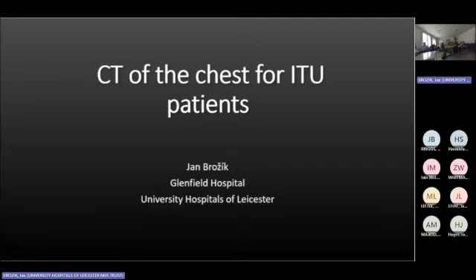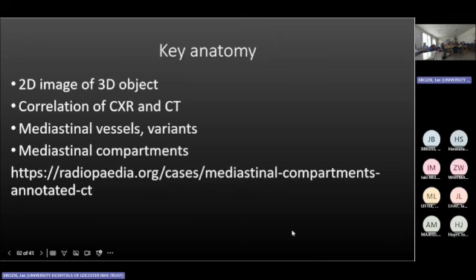Okay, so last time we spoke about chest X-rays on ITU. Now I would like to focus on CT, but I cannot resist it. I'll show you a couple of X-rays as well. If you want to look at a CT scan, it's important you are aware of the key anatomy, and that you are looking at a 2D image of a 3D object.